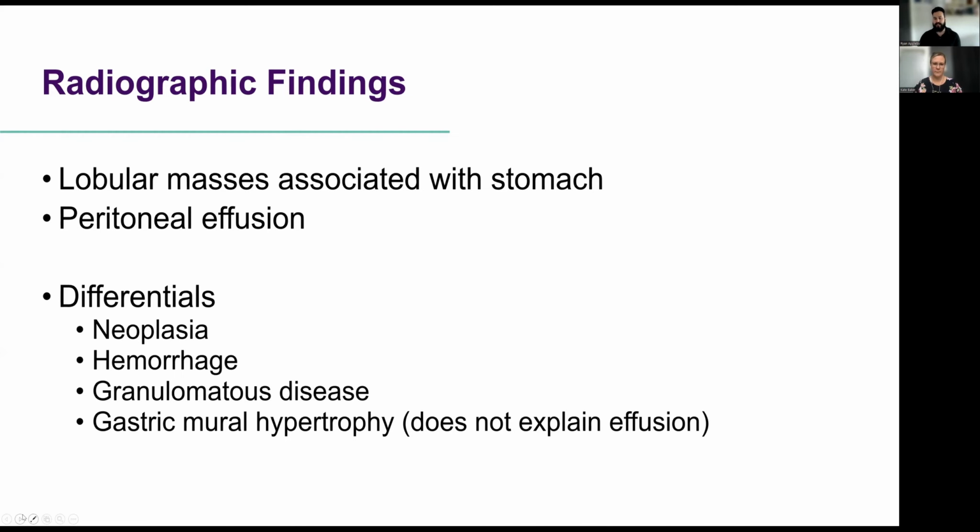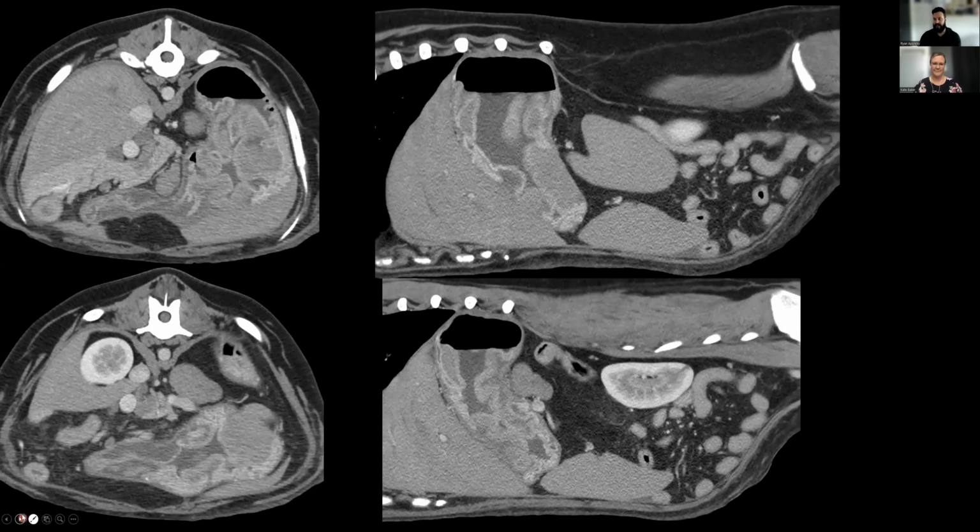And for us, that's some additional imaging. In this case, at my practice, we have access to CT, which is what we ended up performing in this dog. So I'll just highlight quickly a couple of the CT findings. I know most of you don't have CT in your practice, but either ultrasound or CT are going to give us some really good information in this patient.